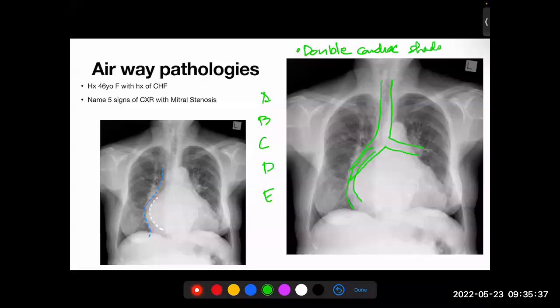You remember we said, when you look at the heart, I jumped. I'm sorry, I jumped. Let's be systematic again. So we have said that on the airway, there is splaying of the carina, we've agreed. Then on the lungs, someone talked about the fact that the cardiophrenic angle is obliterated. So let's go through the lungs from up here. It looks normal to me, normal up here. But then there is this shadow of the breast that is confusing some people. So that's just the breast shadow. So I think the lung is normal.